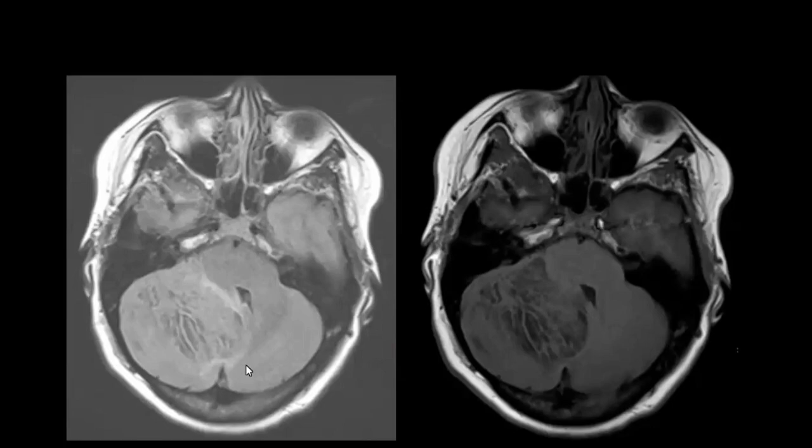It's very bright on T2. Every bright lesion is not cystic. Right, there are some cystic areas, but the whole lesion is not cystic. Okay, sir, it can be astrocytoma, glioma, ependymoma. It can also be ependymoma. Okay, which is heterogeneous. Okay. Yes, sir.